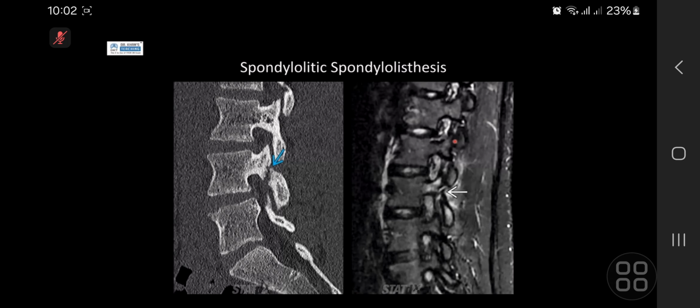Other examples of stress-related injuries is a pars defect. Here in kids, not always, you get the slippage, the spondylolisthesis, the anterolisthesis. You know why? Because this thing sticks to here, and you've got the two bits acting like hinges, protecting this from slipping forward. When you've got the fracture there, if it's bilateral in particular, then you lose that little grip between the bone edges, so this whole thing slips forward. That's why I've got an anterolisthesis of the upper vertebra relative to the lower vertebra.